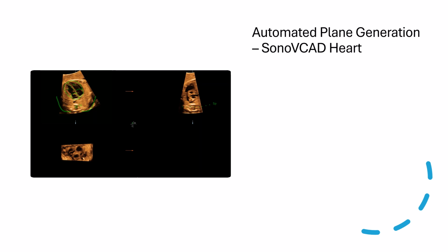So let's explore the power of automation with Sono-VCAD Heart, a groundbreaking tool from GE that transforms how we interact with volumetric cardiac datasets. What we're seeing here is more than just a 3D volume, it's the intelligent alignment and automated generation of diagnostic planes powered by GE's proprietary software.